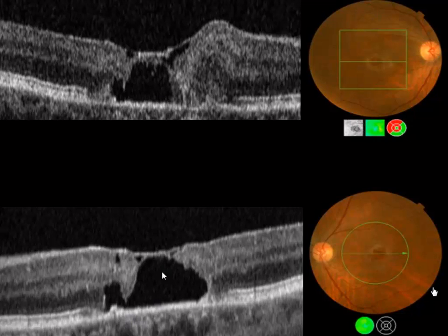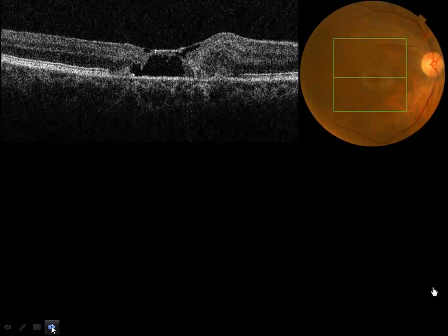Here's the right eye and the left eye of this patient. And with the draping, if you will, that's a term that's usually used. The draping of the internal membrane can actually come all the way down. This is close to being pathognomonic, not quite pathognomonic, but very typical of patients that have MacTel 2, classification 2.